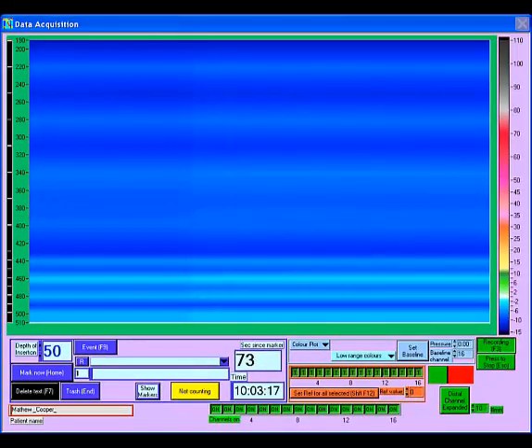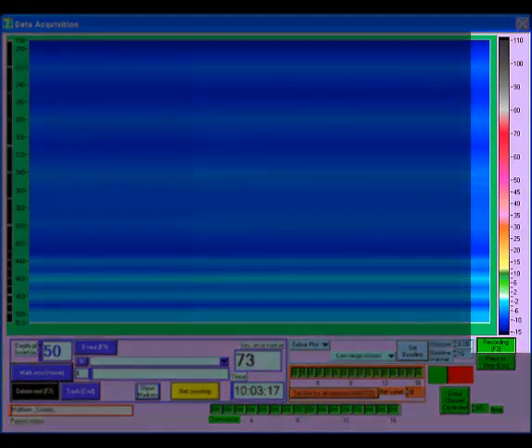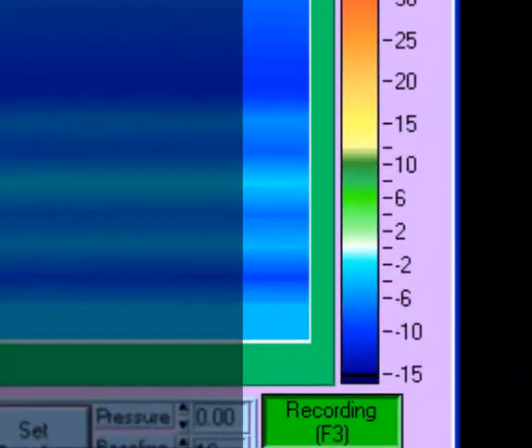The z-axis or colour represents pressure. The colour scale can be seen to the right of the graph. Note that 0 is white, negative pressures are blue, and positive pressures are greens, yellows, browns, pinks, reds, greys and black.